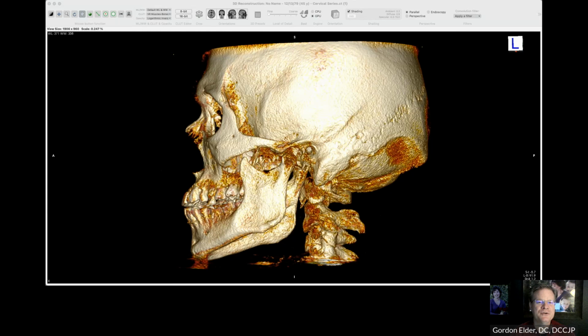Number one, two things. This is an analysis with cone beam CT scan used for articular analysis. Articular analysis was developed primarily by Dr. Blair back in the 60s, so it's quite dated. He was using plain film x-ray, then we moved to digital x-ray, and now we're using cone beam. So we've adapted his process. I think over time, now that we're using cone beam and 3D analysis, you'll see some changes in how things work. In fact, some of them have already crept in, but we're going to do more testing on that.